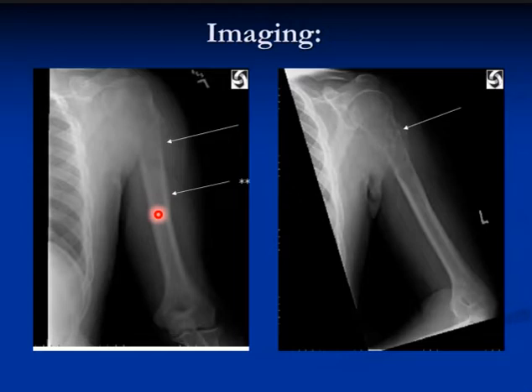There is also periosteal reaction. Good. I see some cortical breach at that area, some periosteal reaction and some cortical breach right here. There is a wide zone of transition. It's an ill-defined wide zone, destructive lesion mainly, right? Picture of an aggressive lesion. According to the history, this could be an inflammatory like osteomyelitis, or it could be neoplastic, like osteosarcoma or Ewing.